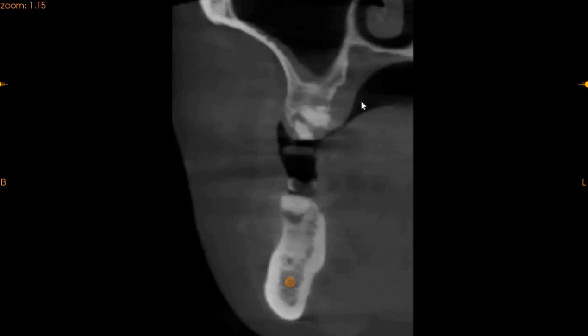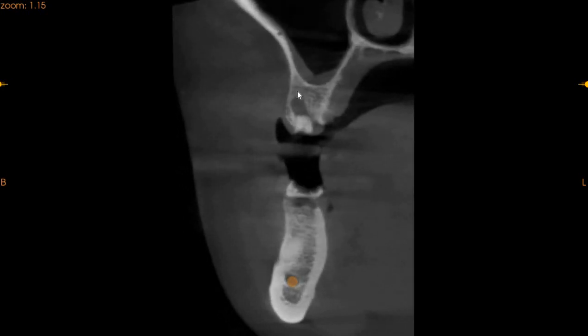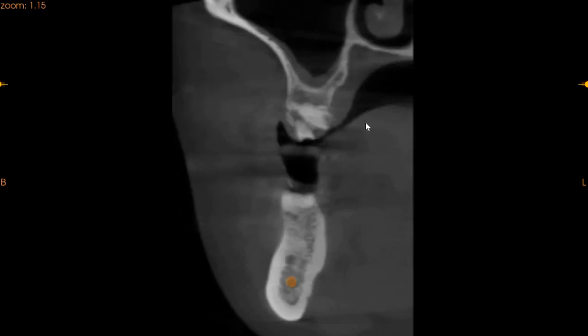Moving to the first molar. The first molar, we've got very disintegrated roots. We can also see major periapical radiolucencies. The approximate width is 9.7 with the height being 9.1, but the quality of the bone is D4 in this region because you've got absolutely no cortical plate and very radiolucent cancellous bone as well.